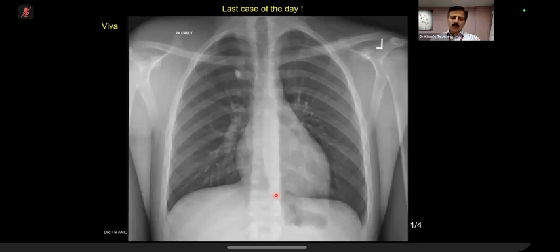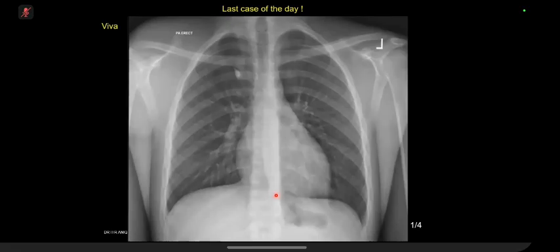Don't worry. Look at the soft tissues, please. So on the right, projected over the right clavicle, there's increased soft tissue swelling compared to the contralateral side. So it looks quite expanded. The actual bony clavicle doesn't appear to have any associated erosions.